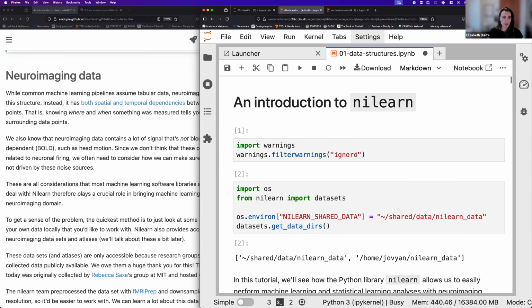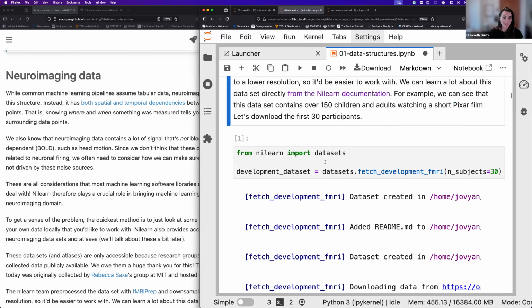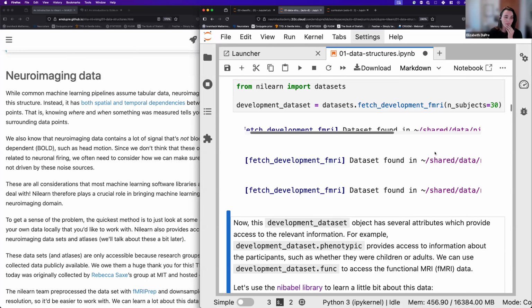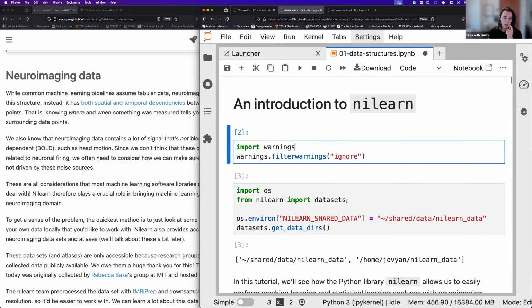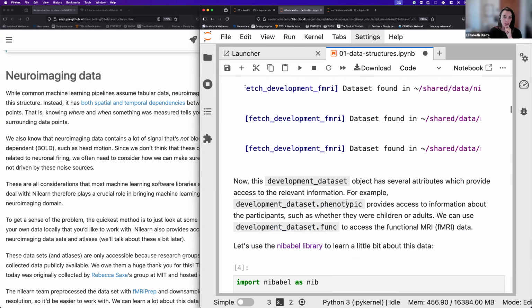And this should just run for a second. If my shared datasets worked, it might tell you that the dataset's already found because we have a copy locally. If it doesn't work, it'll tell you it's re-downloading it. Let's see. But yes, ideally, if we've executed this command, it knows it's on the JupyterHub.